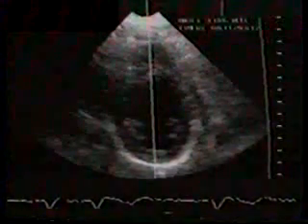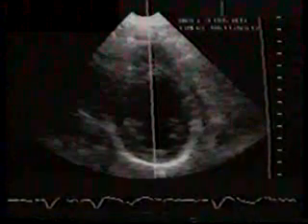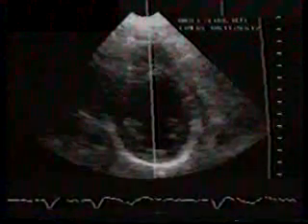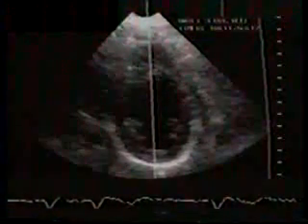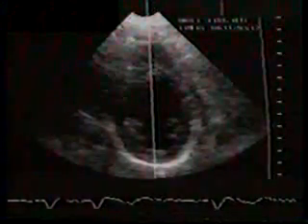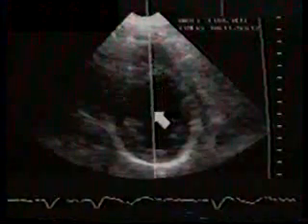For patients with mitral regurgitation, we still find that the 2D derived M mode from the mid-left ventricle is useful for determining left ventricular dimensions for serial follow-up. In this patient, who has mitral valve prolapse, the M mode cursor has been directed across the left ventricle. This is the corresponding M mode. The left ventricular cavity is enlarged, measuring 64 millimeters in diastole and 36 millimeters in systole.